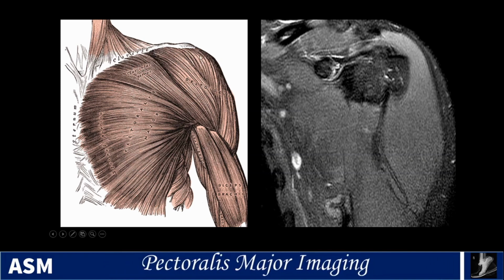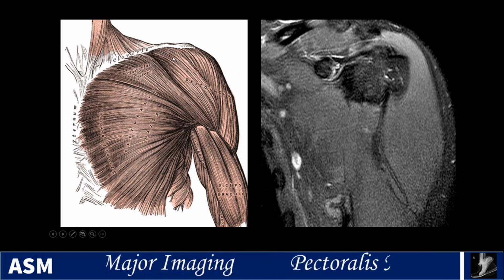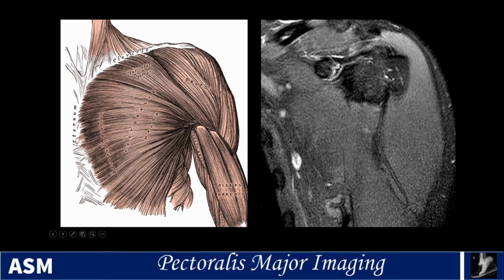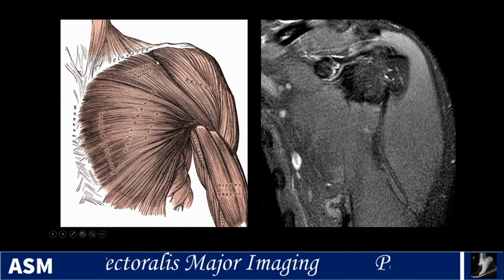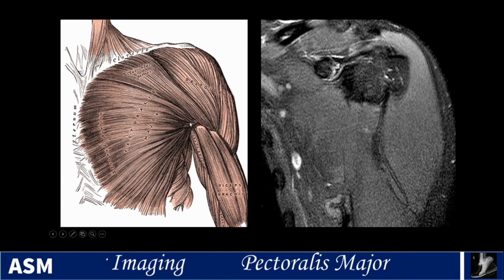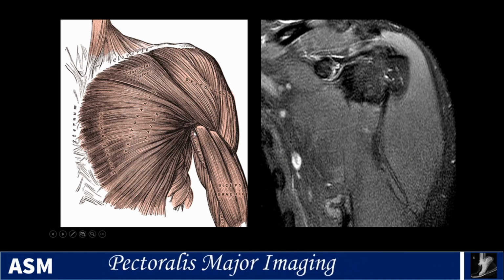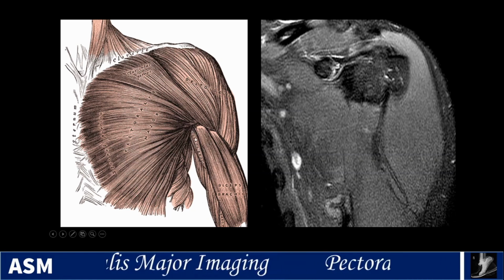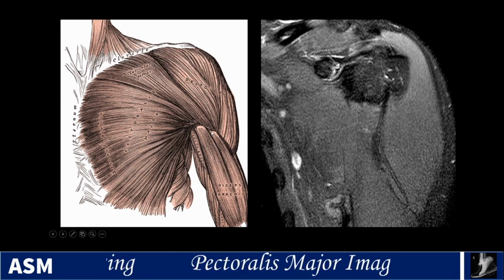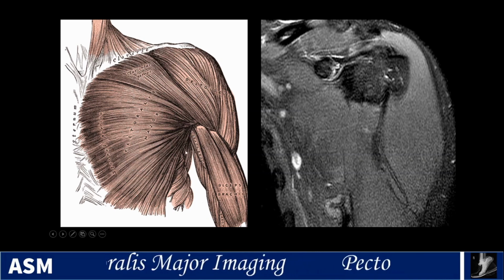The other muscles in the immediate general vicinity are the deltoid muscle, and there are multiple bellies, but the anterior belly is right next to the clavicular portion of the pectoralis major, and in this groove, the deltopectoral groove, will run the cephalic vein, so you can use that as a landmark. As you come towards this broad humeral attachment, there are several muscles in close proximity. Medially, the coracobrachialis, and as we start moving laterally, the short head of the biceps brachii, and then the long head. If you look posteriorly, you'll see a little bit of the latissimus dorsi here.